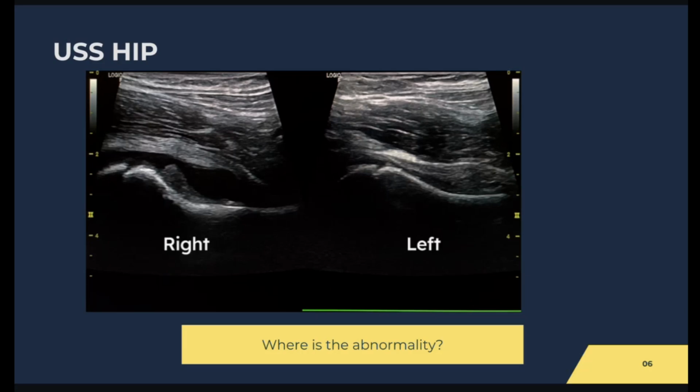So we've had right due to fluid level, and we've also had that some people think that there's fluid on the left. Looking for some more opinions to see.